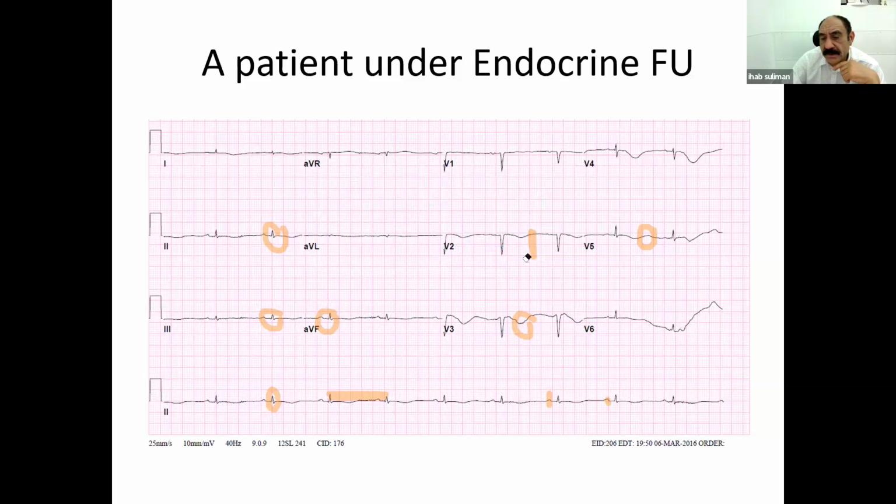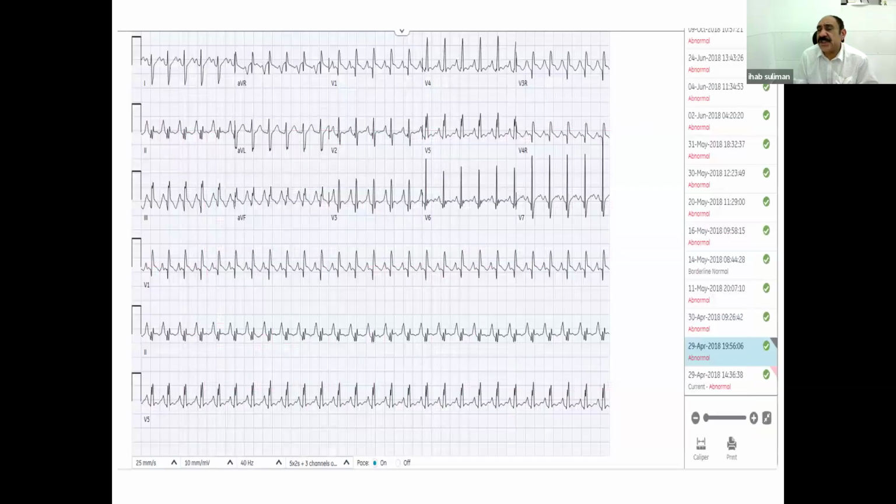So we move on to another example of an ECG scenario. So let us move on to this. This is a child ECG. Children's ECGs are usually tachycardic. Don't think that this is atrial flutter, no, this is like sinus tachycardia.